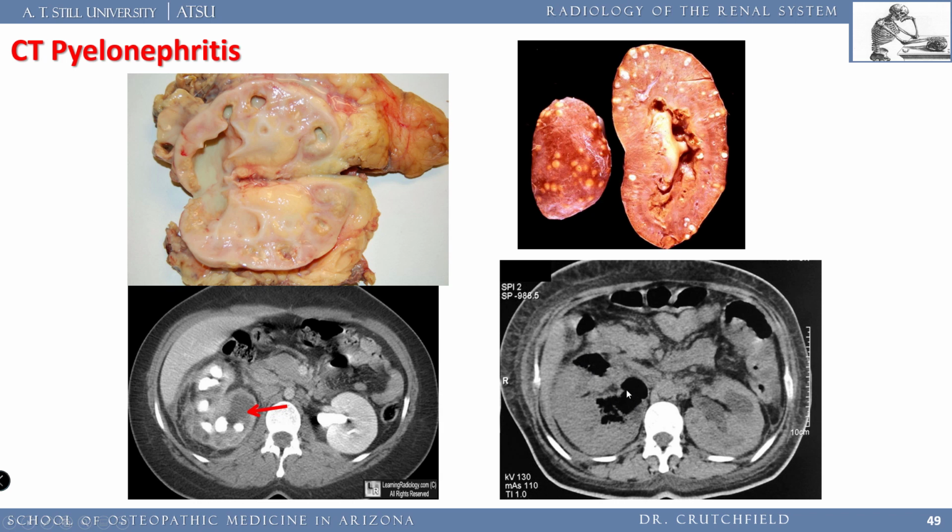Or this could be that they've already instrumented this kidney and maybe gone up and tried to drain it and got air into the kidney that way. But I doubt it because this kidney's got pus in it right here. Over here, we got an abscess right there.